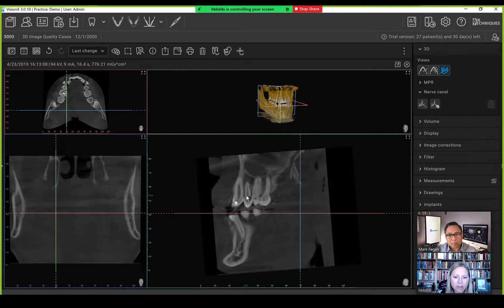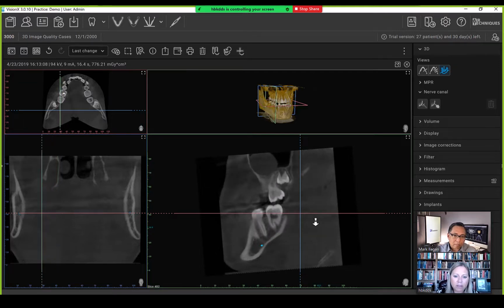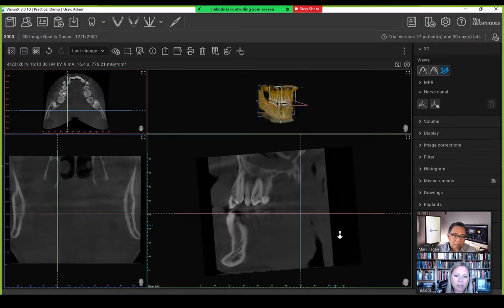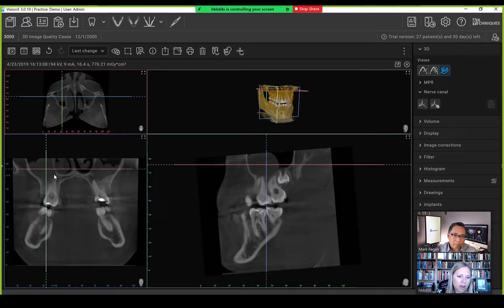And yeah, our premolar looks like we've got a little apical lesion going on there as well. So our mucositis on this side, it's kind of interesting. I would say we do have mucosal thickening that may not be odontogenic in origin, but we do have some that may be odontogenic in origin.